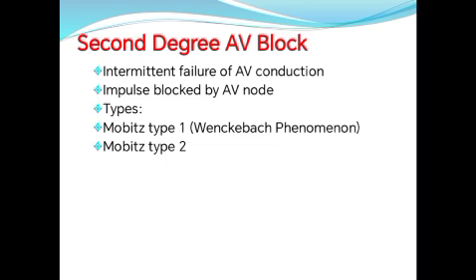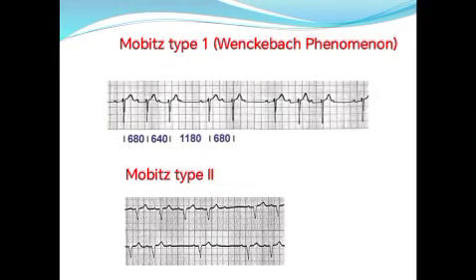Mobitz type 1 is what's called the Wenckebach phenomenon. Here we have a progressive prolongation of the PR interval, then a dropped beat. We will see this here.